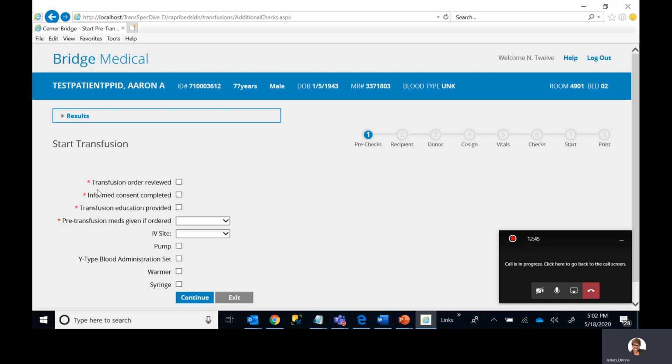What you will see is an asterisk in front of each of the line items that indicate these are required for documentation. This is also a design decision when, after you begin reviewing and making changes to this, if changes are needed, you will have to identify what should be required documentation. So I'm going to document all of these that are required fields. If it's not required, you can bypass it, which is what I will do by clicking continue.